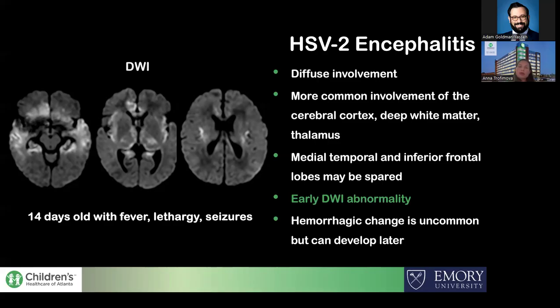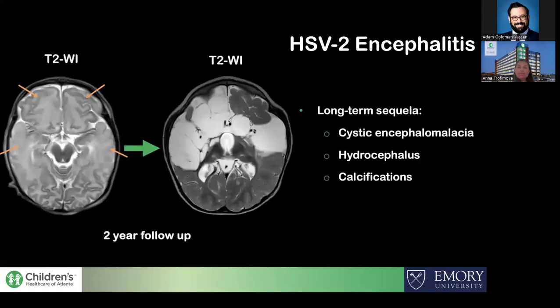So overall, it's really important to keep this encephalitis in mind when you see any restricted diffusion in a neonate presenting with infectious symptoms like fever, just because the consequences can be quite severe.